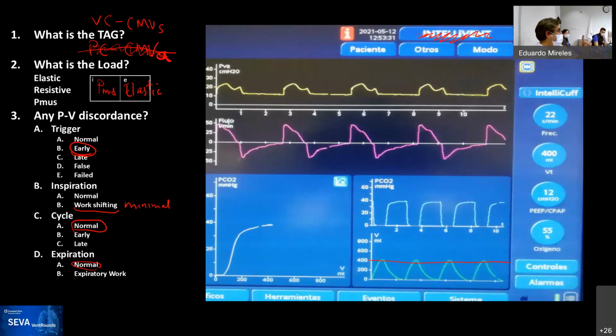Compare the prior one with this one, and the level of irregularity was huge. In this one, and we see these patients now and then, they're sedated, they're coming out, but they're practically not doing anything, and it's just following each one of those. So that's why I think there's a degree of neurotoxicity from our sedation that is causing these patterns of activation of the muscles.